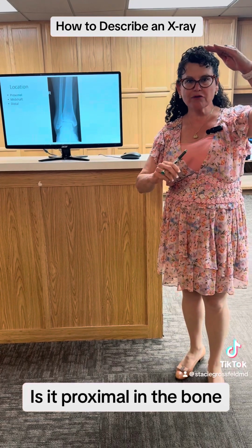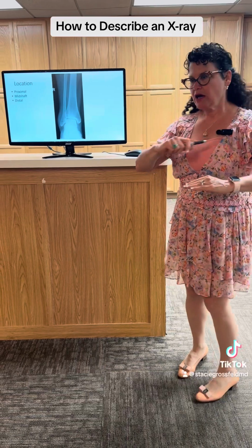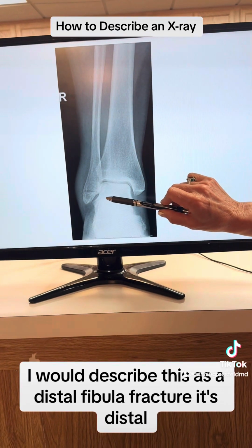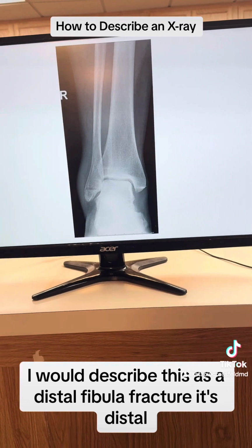Number two is you want to describe the location of the fracture. Is it proximal in the bone, midshaft in the bone, or distal in the bone? On this x-ray, this is a tibia with a fibula. The fracture line is here, so I would describe this as a distal fibula fracture. It's distal.